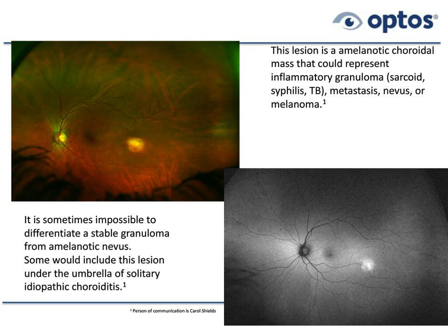This patient deserves a fluorescein angiography, which we'll talk about a little bit later, where we want to see whether there's leakage or any new blood vessels growing into that lesion. And this patient may deserve a systemic workup, at least for inflammatory disorders such as sarcoid, syphilis, TB, etc. So we don't really have a bottom line on this patient. The patient never showed for the fluorescein, but hopefully we'll be able to get this patient back.